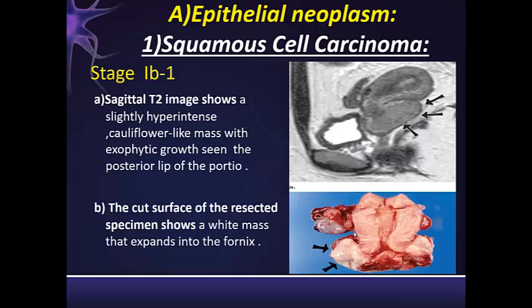The most common that we fear are the epithelial tumors of the cervix. We have many pathological entities, but the most common is the squamous cell carcinoma. The squamous cell carcinoma has a typical appearance on MRI. In sagittal T2, it is a hyperintense mass arising from the cervix, sometimes engulfing most of the cervix with no residual zonal anatomy seen. Usually we say that radiology is pathology in shadows. So if we have an exophytic mass on pathology, it is mimicked on imaging.